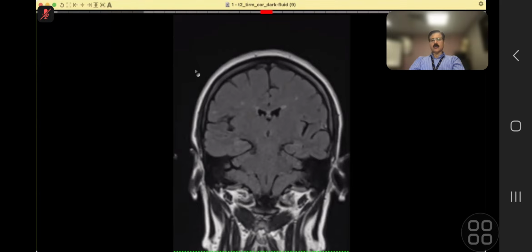So in our hospital, what we do is, NICE guidelines are that TIA patients should have an MR within 24 hours. So we have got one-stop clinics where they come, we have got special slots for them, even just 1 hour before the working hours start, and within 2 hours, they are seen in the clinic. So this is that kind of a scan.